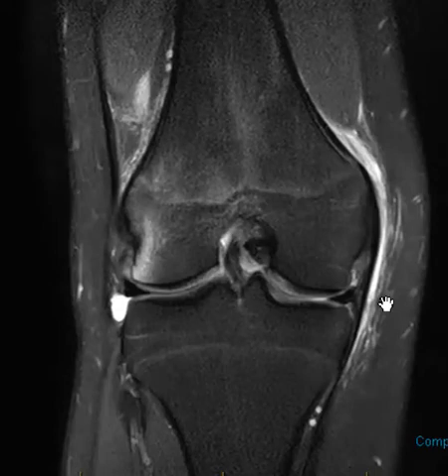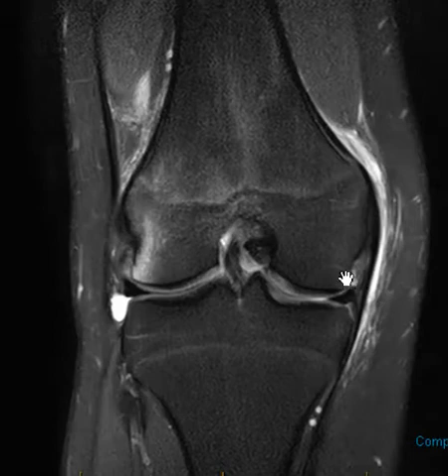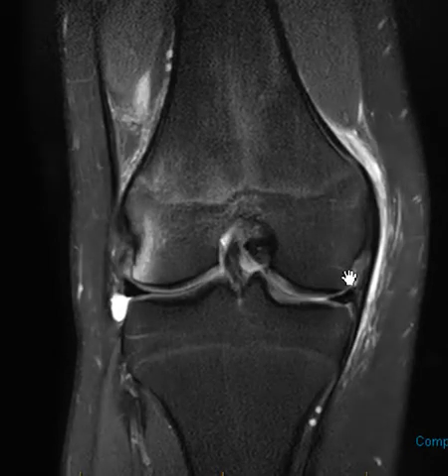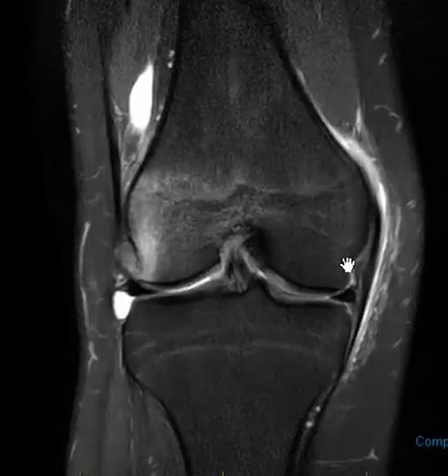Hello, this is Dr. Gay from First Look MRI, and this is a 17-year-old male who had a recent injury and felt a pop in his knee, has knee swelling and pain, and he has a very straightforward classic finding. And we're going to see this on a coronal view to start with, and then we'll go to an axial view next. So on this coronal view, we're looking straight at the knee, kind of like an x-ray.